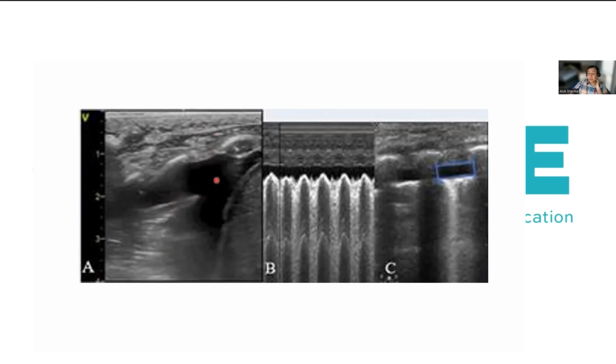In terms of placing drains, you want to place them in areas with the largest pockets to maximize the therapeutic efficacy of the drain. And the beauty of the ultrasound is you can demonstrate those pockets using a transverse ultrasound technique that I will talk about today. More importantly, there are certain ultrasound signs which help you quantify how large an effusion might be. And this is M mode.